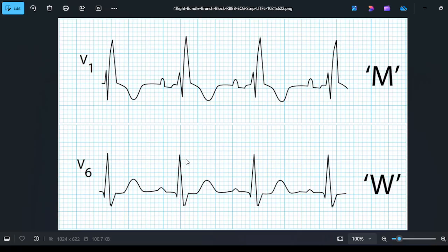So that means the distance between two QRS complexes is near about 4 or 5 big blocks. Okay, not less than 4, not more than 5. So that means the rate is normal. Once the rate is normal, it is not a rate disturbance, so we'll check for any abnormalities. For abnormalities, what do we have to check?